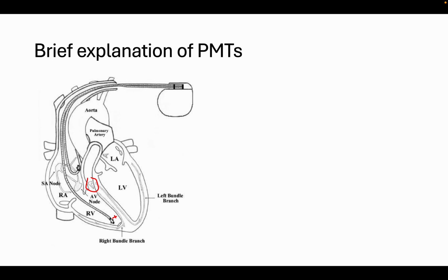So if you don't know what a ventricular ectopic is, check my ventricular arrhythmia video out. But essentially, that will have retrogradely conducted up the atrioventricular node into the right atrium, causing a retrograde P wave. That retrograde P wave is picked up by the atrial lead. That then sets off a timer for the ventricular lead to wait for an intrinsic QRS. We know our right ventricle is in refractory because we had a ventricular ectopic, which is an early beat, already occur, so nothing's going to happen.